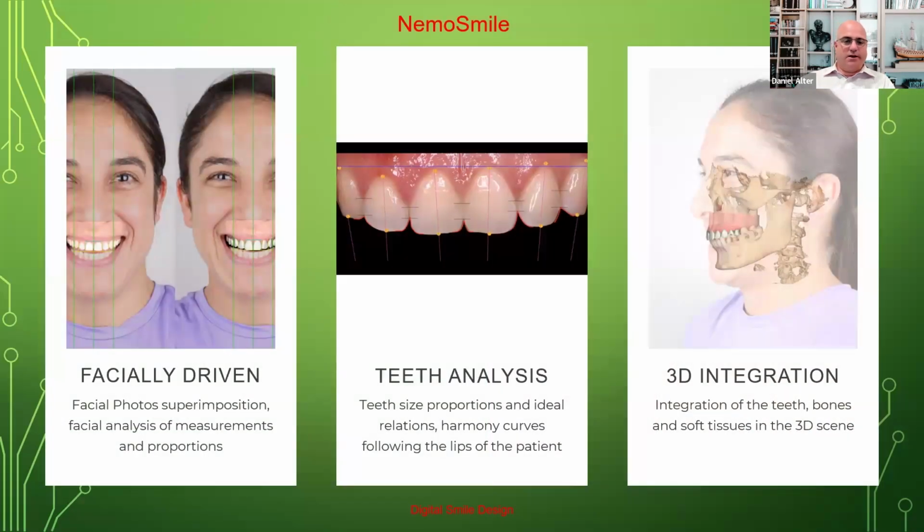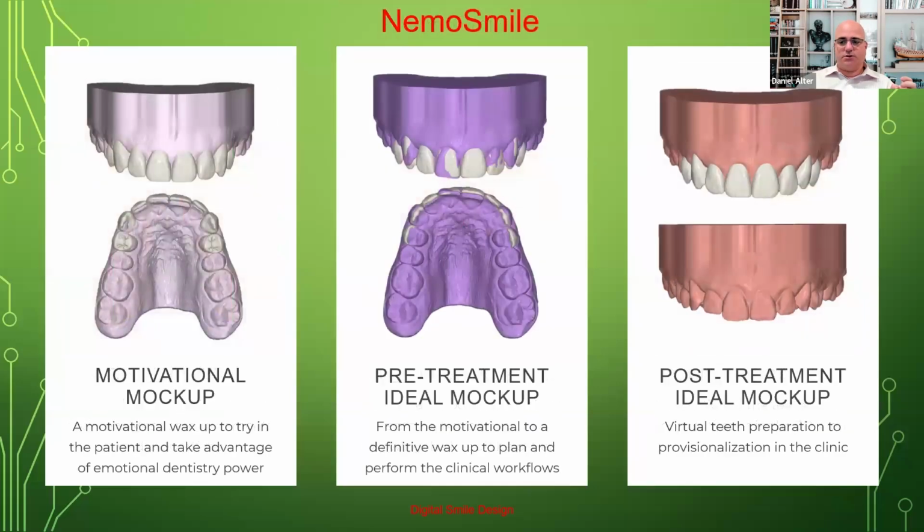Now, there are clinicians out there that are doing either a facially driven, really quick teeth analysis for orthodontics, or even composite mock-ups, where you can create as a dental laboratory a guide in order to do a composite mock-up for a smile design. As well as, obviously, you have the 3D integration, as you see here.